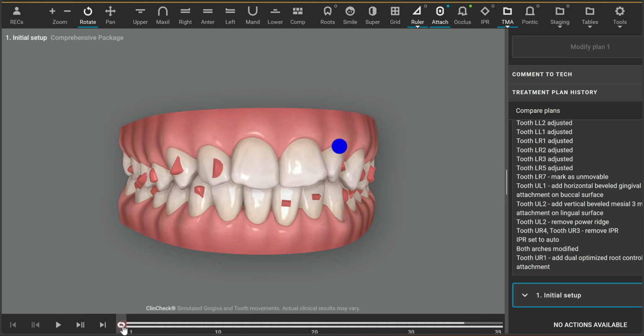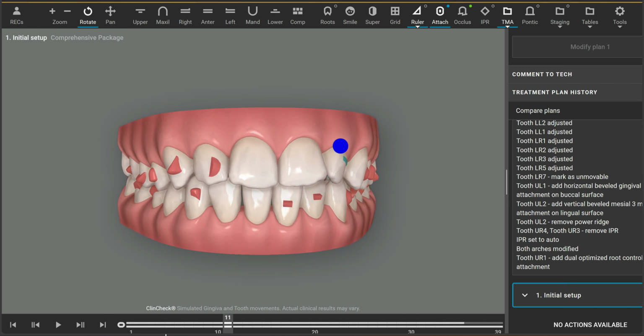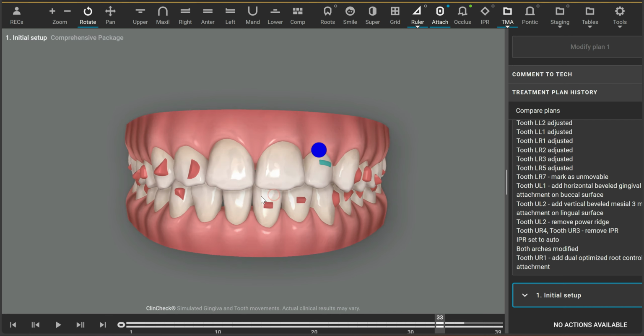Other than that, the anterior teeth need rotation. The incisal plane looks about right. I think it's just those posterior movements. I really didn't change or modify anterior movements much. I didn't cancel them because it's not necessary. You need to move anterior teeth to create the proper aesthetic outcome. So here's the initial treatment plan.